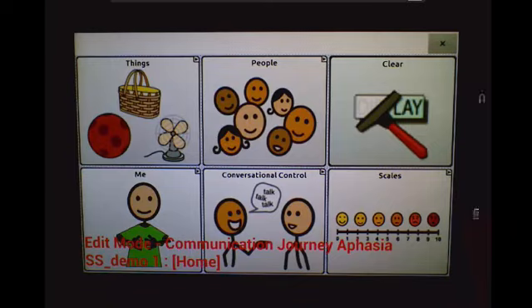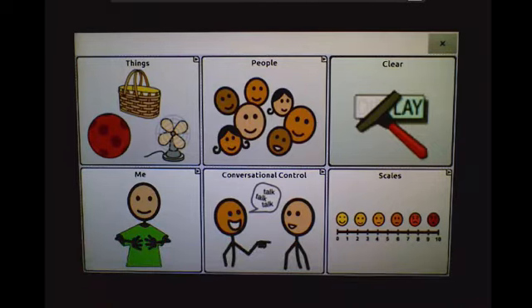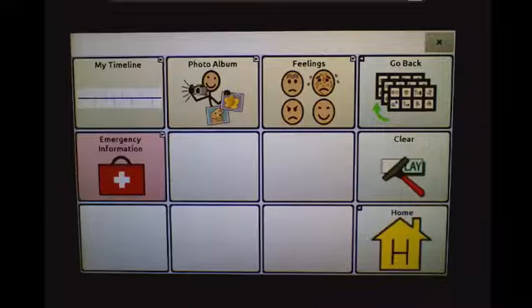I can tap Menu and then toggle out of edit mode and tap to retract the screen again. I have my 6 grid layout with my desired buttons. When I tap one of the buttons, I will find that the next page will contain 12 buttons. I will need to make a determination if I need to limit the grid size on all pages, some of them, or just the home page.